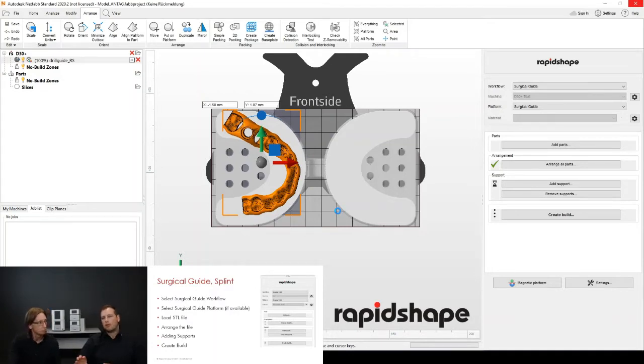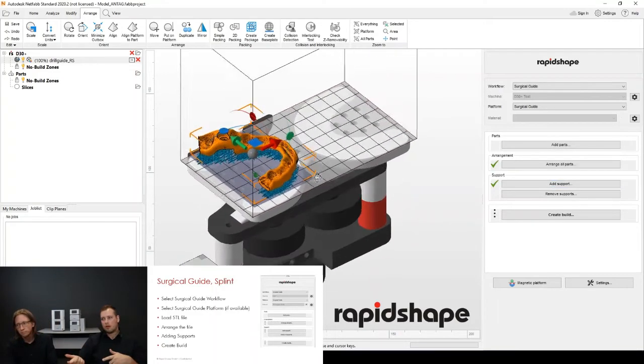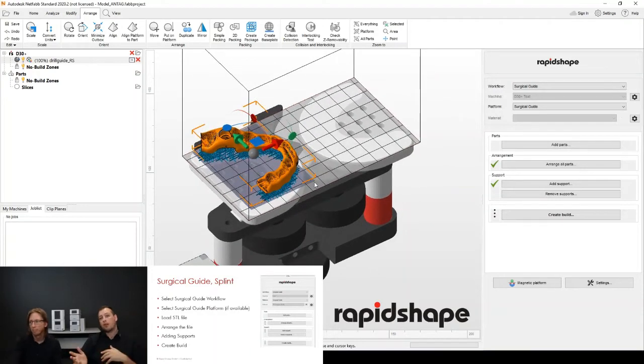The loading time it takes to create the supports is entirely dependent on the complex design, or the amount of triangles in your design. So sometimes this can be very quick, other times it could take a bit longer.